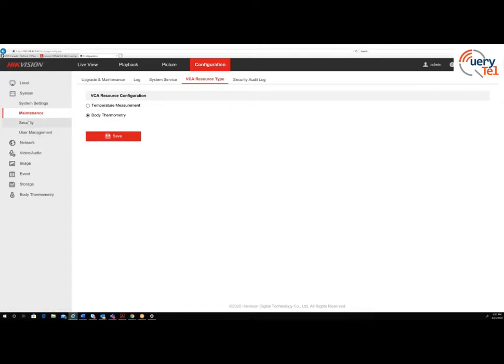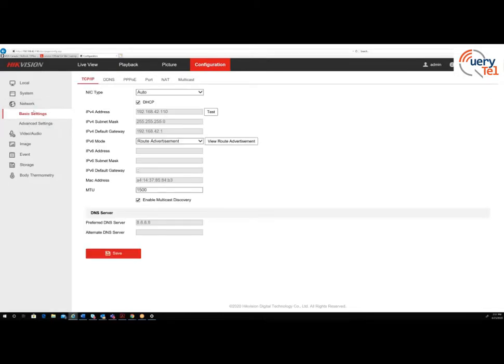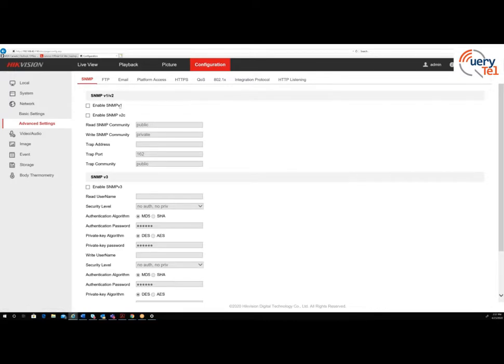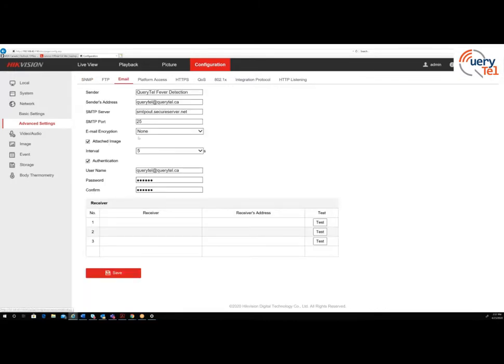Once this is set, we'll go to network, then email. I've already populated a name, QueryTel fever detection, sender email address, server. We have used a simple sender account, not an Office 365 or Exchange account in this scenario.